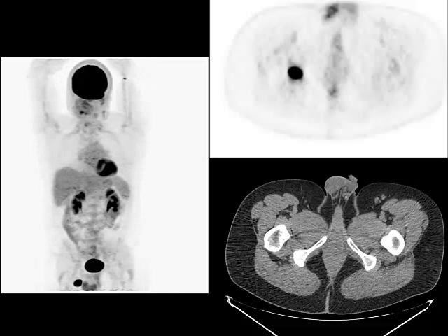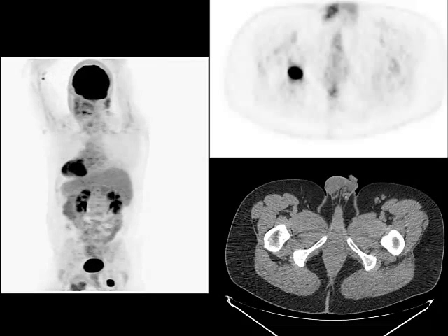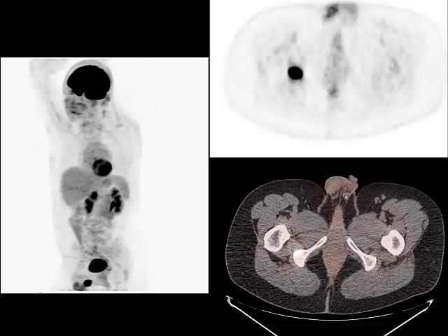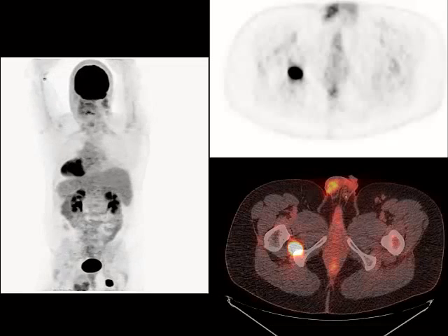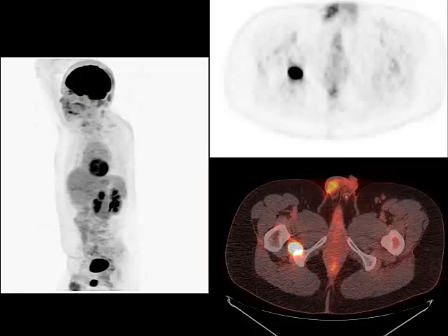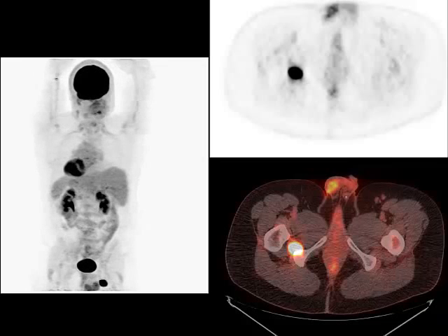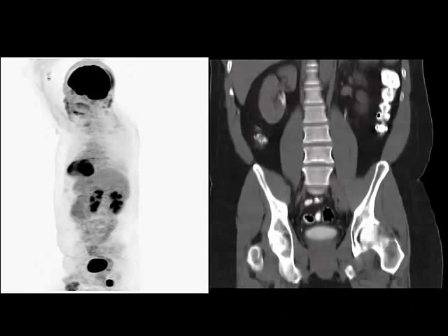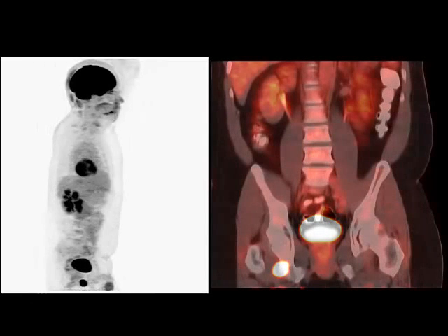Another case example, this was a patient with lymphoma that had been followed for a number of years, where we consistently saw this focal activity here sitting below the ischium on the right-hand side. And intermittently on some PET scans, we said that that was post-traumatic. Sometimes we said it was nonspecific. But eventually you start seeing this time and again and start to think maybe there's something else going on. You can see this on the coronal images, again, sitting adjacent to the ischium.